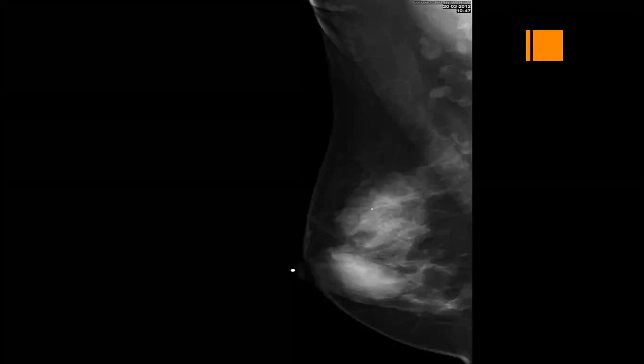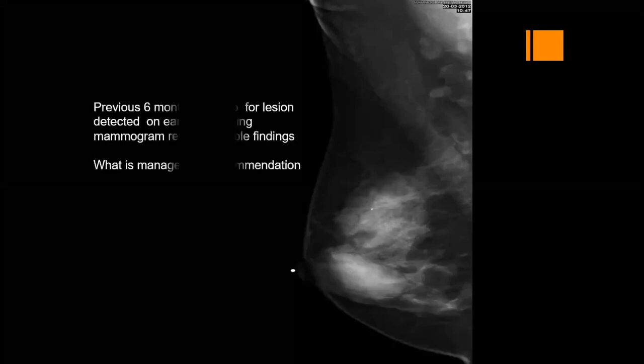It really depends on whether this is diagnostic or screening. If it is screening, I will put it as 0 and request an ultrasound. If I tell you it was seen on screening and after diagnostic workup it is the same, and a 6 month follow-up was performed and it was stable, then it is stable after the screening.